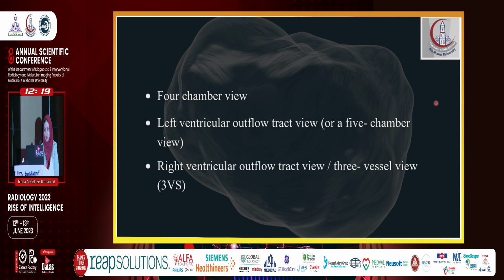Second, we'll talk about the basic views of the fetal echocardiography and additional views. The basic views are the four-chamber view, the left ventricular outflow tract view, and the right ventricular outflow tract view, and there are other additional views like the three-vessel view, the three-vessel trachea view, and the bicaval view.